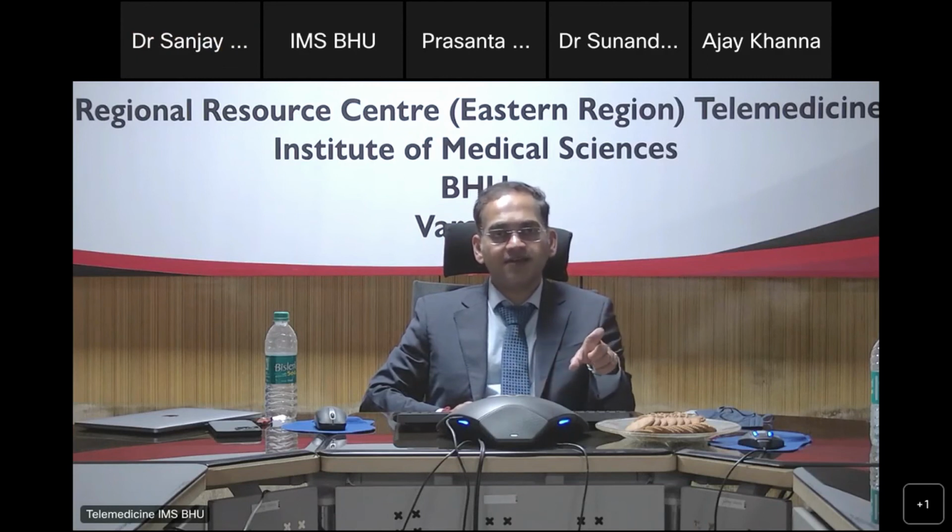Our cardiac CT acquisition includes the entire heart and also the ascending aorta all the way to the level of the pulmonary artery bifurcation. I hope that radiologists looking at these kinds of lesions will consider obtaining a cardiac CT instead of a single phase CTA. That would be really helpful here.